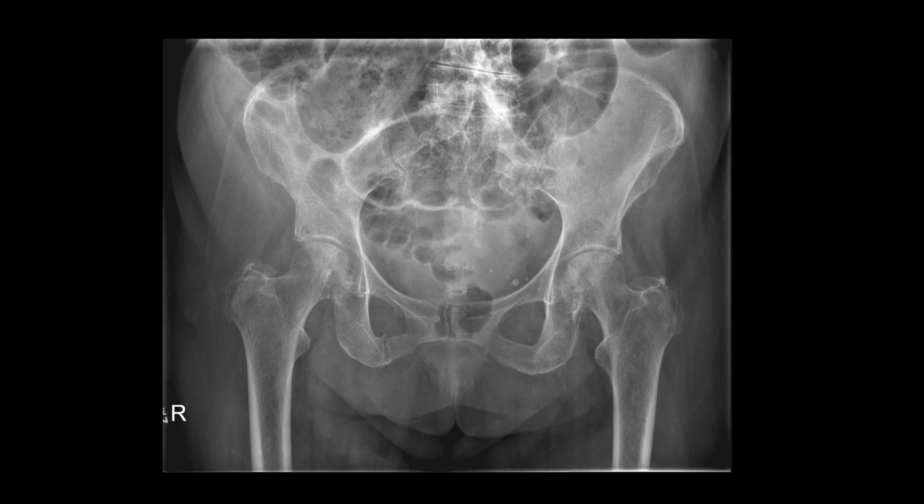So now at this point I will start going towards just the main findings that you should have picked out, and hopefully when you would have traced our obturator ring on this side, you'll see that actually we have this step over here, the area appears more lucent than we would expect, for instance on this side, over here, to suggest a fracture of the superior pubic ramus. And you can also see another break inferiorly to the inferior pubic ramus, suggesting fractures of our pubic rami.